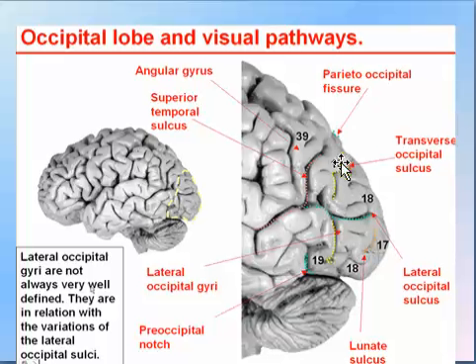The parieto-occipital fissure, this is the one, which separates the parietal from the occipital. This is number one. Number two, the occipital lobe is resting on the cerebellum, and medially there is a perpendicular line to this sulcus, like that way, but it is medial. It's called the calcarine fissure, and is responsible for the visual area.